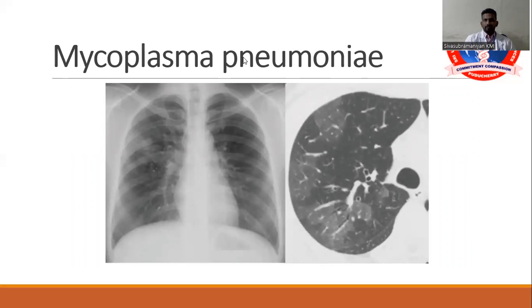Again, now this is very interesting. We can see that there are patchy opacities in the right upper lobe of the lung, but you're not able to see much more on the plain radiograph. And you can see that the left upper lobe and the left lower lobe appear uninvolved, and the right lower zone of the lung also appears normal. So looking at the plain radiograph of the chest, you could say that there is a semblance of a lobar pneumonia.